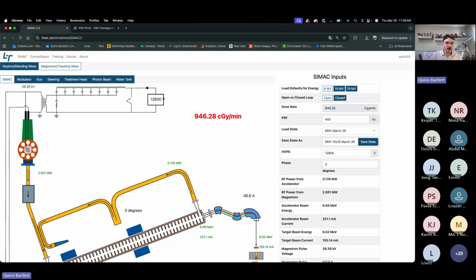And this is the kind of exploration that highlights how simulations can make beam physics concepts much easier to visualize and understand for students and for experienced clinical physicists. Okay, so yeah, that's the demonstration for today.